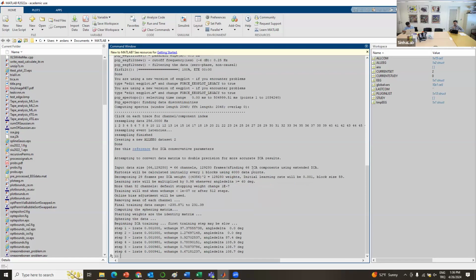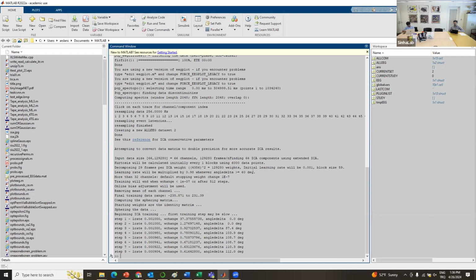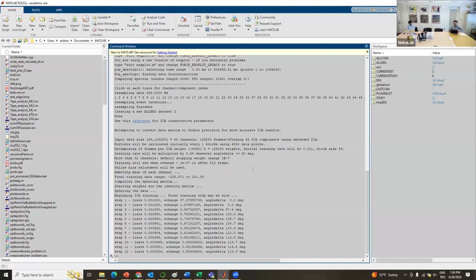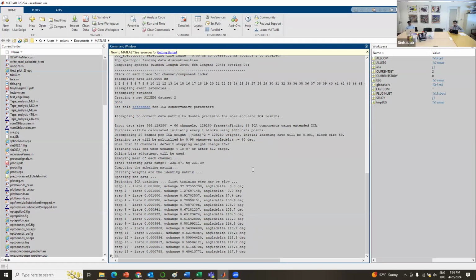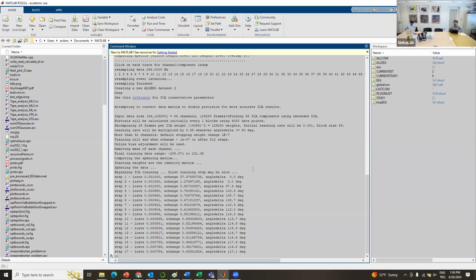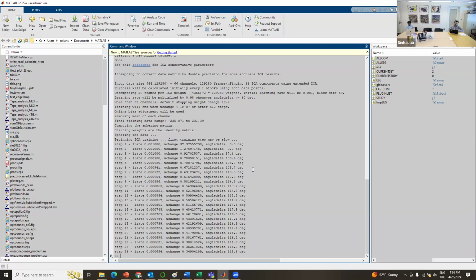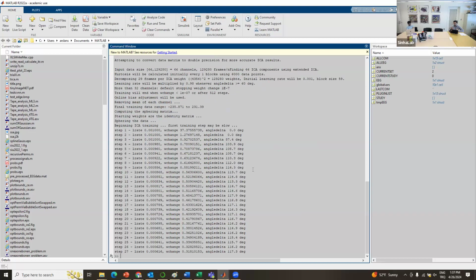You can see from the run that there's a learning rate that you can change, and that learning rate causes some changes in the convergence. You will just look for this change becoming very small. If that change becomes very small, close to 0, then it will converge, and the runica algorithm will end its processing. It takes about 300 to 400 steps, so it would take maybe a couple more minutes.